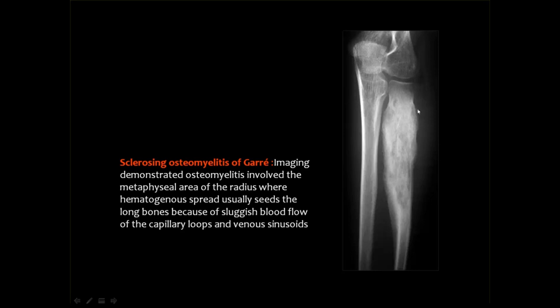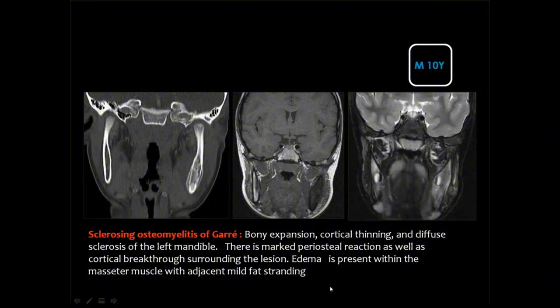And here you can see the fulminant cortical thickening and the loss of the corticomedullary differentiation. Of course, this is completely different from Ewing sarcoma, for example, where you get lamellated periosteal reaction and you get a destructive lesion within the medullary cavity of the bone, and it may be associated with abnormal soft tissue swelling in the surrounding soft tissues. And this is an example in the mandible.